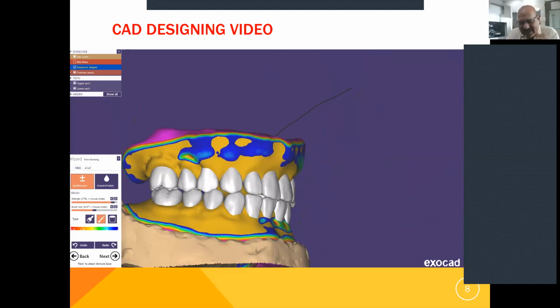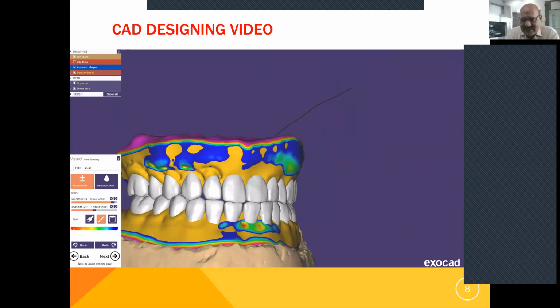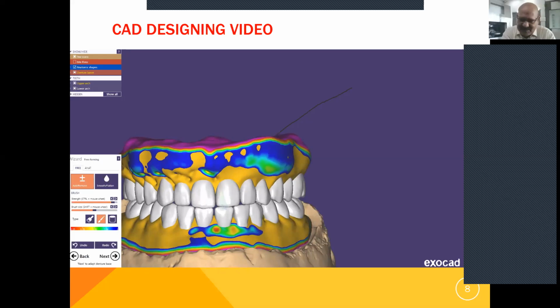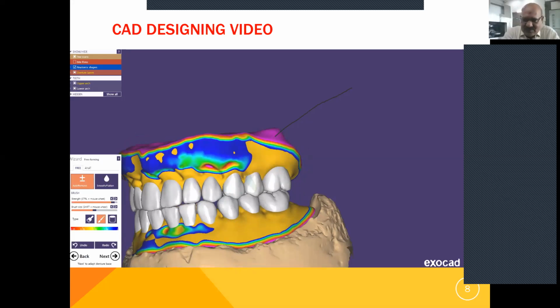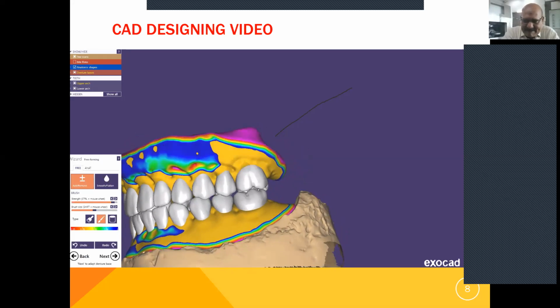Now later, I was preparing it a little late in the evening yesterday, so some error happened, but I think that can be overlooked. What is important to all of us is the tools that I provide to understand how to design it. So I'll request all participants to concentrate on the CAD tools available to give a good look, good design. Just smoothen it if it has gone too deep in.